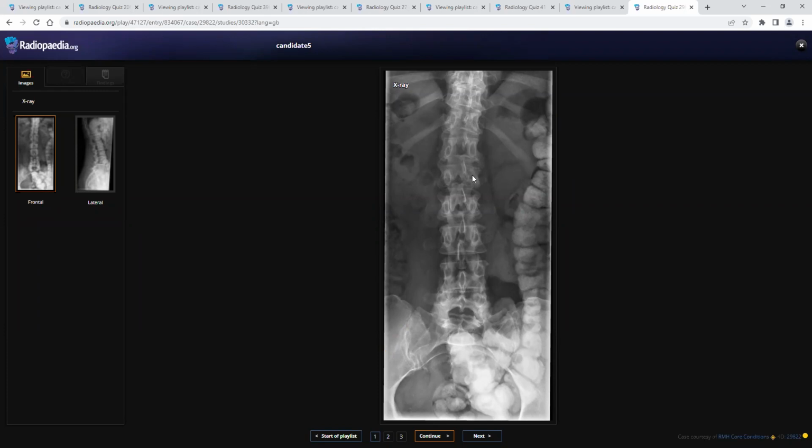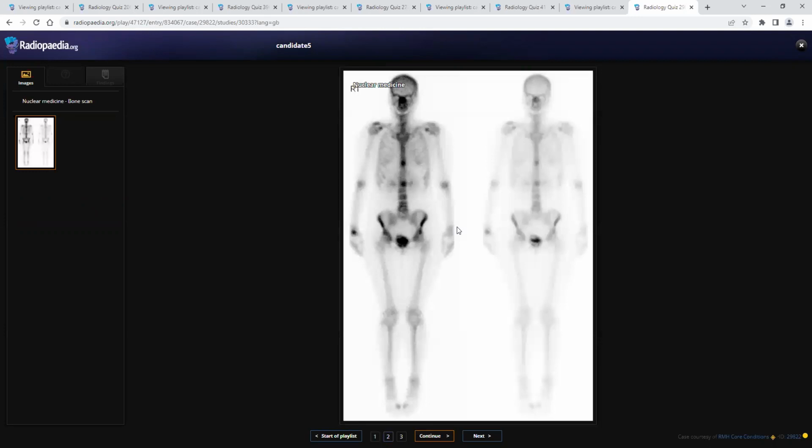The absent pedicle side is classical of metastasis in breast carcinoma or any other malignancy. So this is a case of a metastatic lesion involving the spine from a breast primary. This is the winking owl sign. So I think these are your cases. You did well. Thank you. All the best. Thank you for such nice cases.